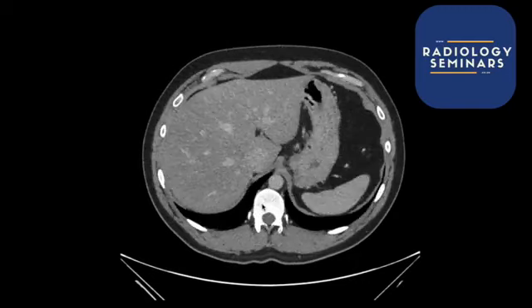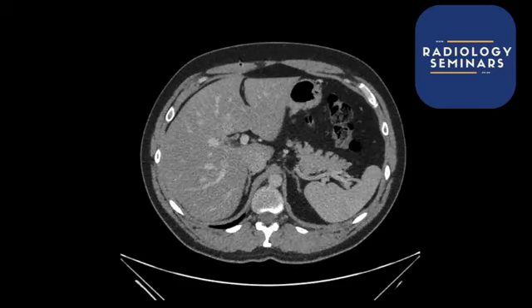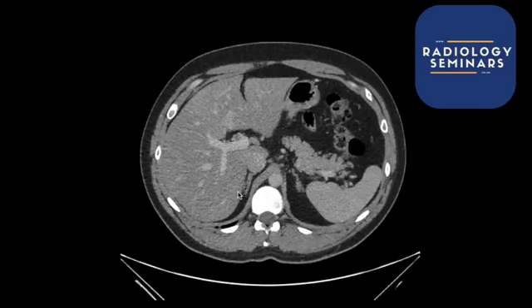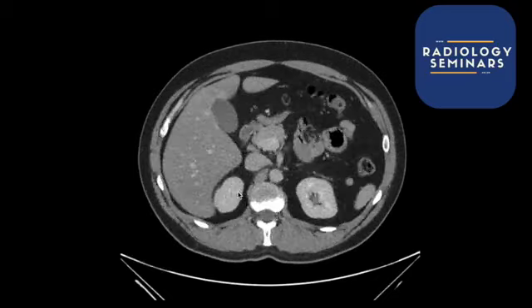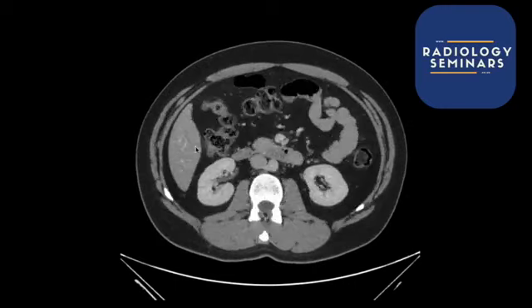Right, so once you've done that, let's go from the very top and go through the anatomy. So I'm going to go through very basic anatomy. There's all sorts of more intricacies with regards to this, but this is the liver. Okay, and this is split into 8 segments, and in the beginning when I was doing reporting, I just used to look it up every single time. Over the years, I used to use segment 6 as my go-to. Segment 6, which is going to be this bit here, the inferior tip of the liver.